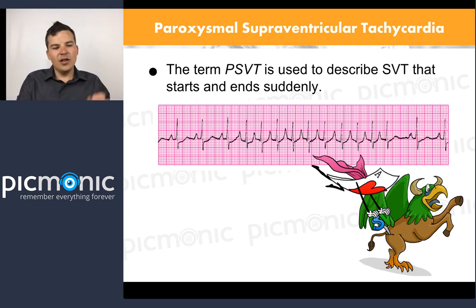Like things are chugging along great. So look at this rhythm here. This rhythm's chugging along great. If you took your hand and covered up this section, from here back, and looked at just this rhythm, and imagine you did that same thing for 6 seconds, everything's great. I mean, it's a great rhythm. So that's normal.